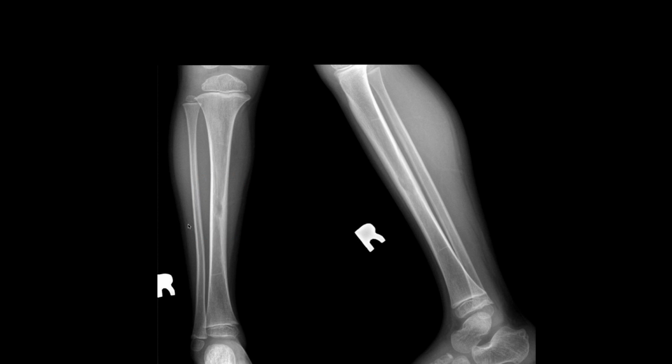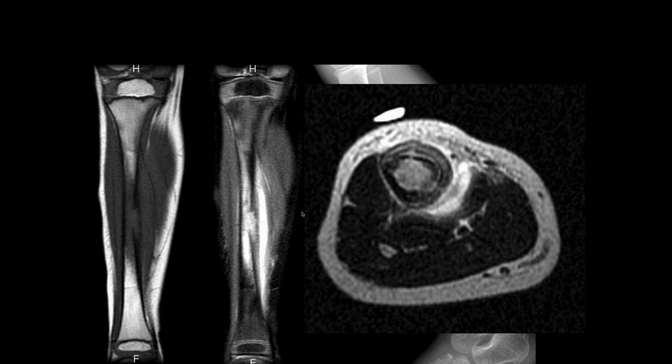You can see increased sclerosis of the mid tibia right there. I'd be worried about a stress fracture. And here you can see decreased T1 signal and increased T2 signal, and the cortical margin looks disrupted, and there's quite a bit of bone marrow edema there. I don't know if it's just the slice selection, but I'd be worried about a fracture, an incomplete fracture here.